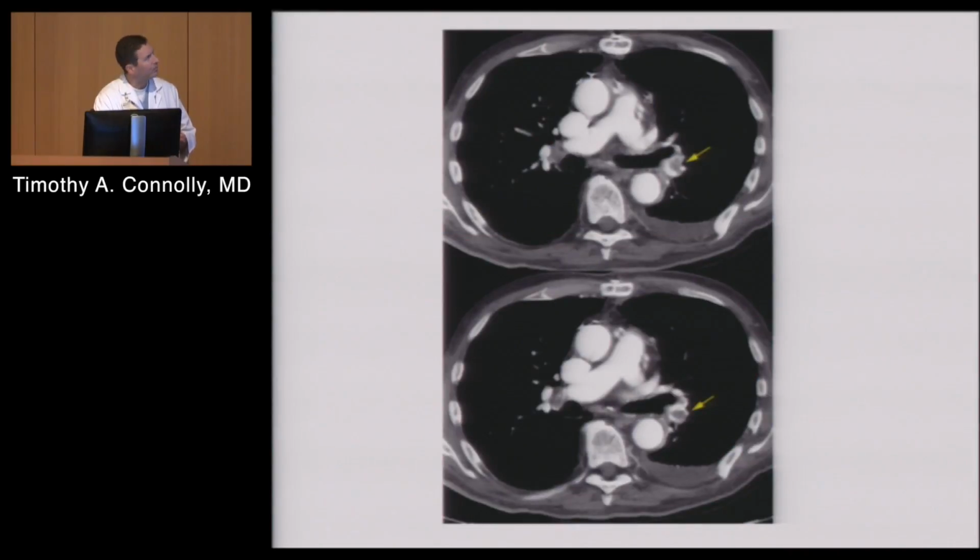Here's some other examples. There's one, there's one. And remember, even though they may only comment on the report that there's a clot here, almost everyone, when they show pulmonary emboli, shows them at both sides. It's very rarely just going to be one side. But really, you're looking at what's the clinical significance: how hypoxic are they, right-sided heart strain, blood pressure, et cetera.